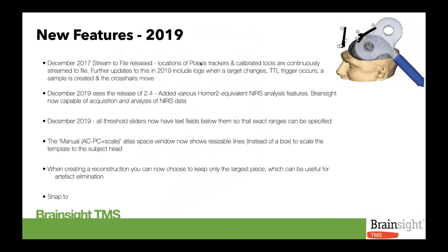So 2019, we saw Brainsight 2.4, and in 2.4, we saw a whole host of NIRS features added. Brainsight NIRS was always capable of doing NIRS acquisition, but now the analysis of that data is capable within Brainsight.